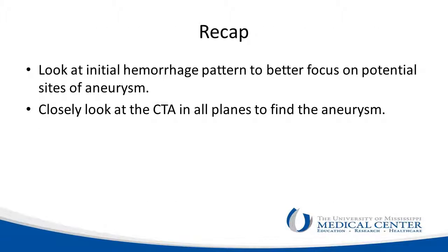As a recap, look at the initial hemorrhage pattern to better focus where you're looking on the CTA to find the potential aneurysm, and closely look at the CTA in all planes to find the aneurysm.